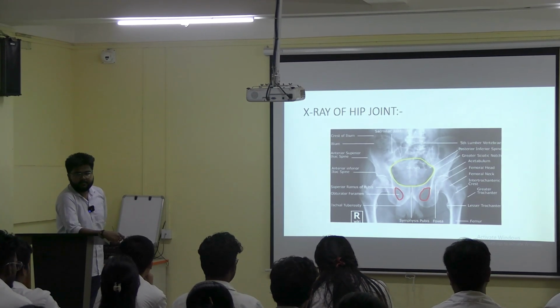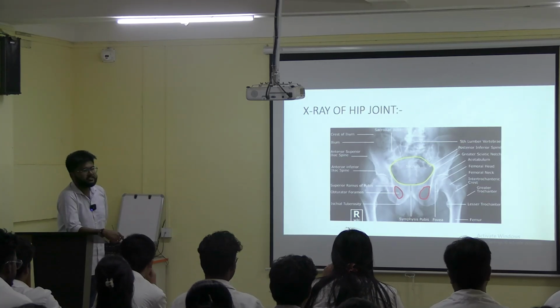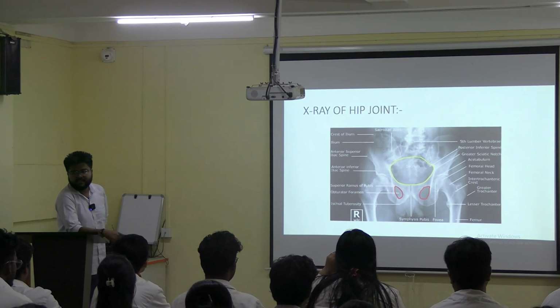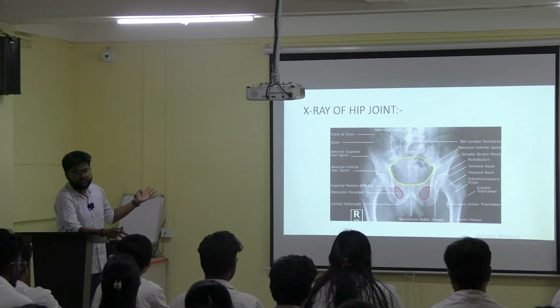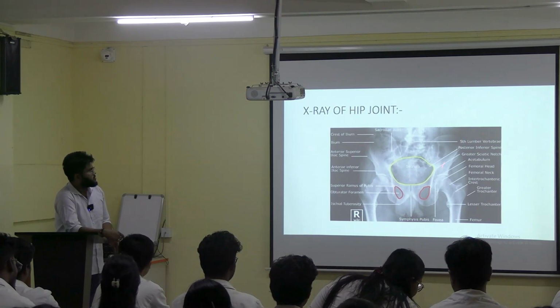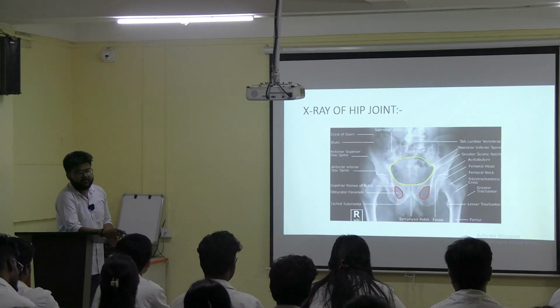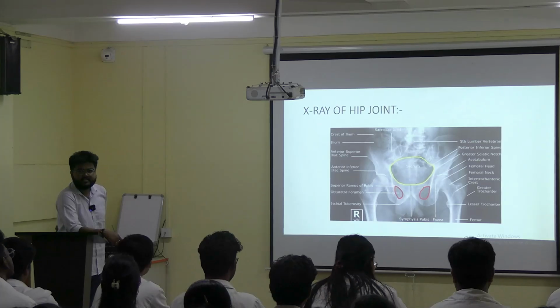The sacrum part and the ilium part of the hip bone together are called the sacroiliac joint. This is the plain variety of synovial joint. So there are 4 joints: the hip joint, which is the ball and socket type of synovial joint; the sacroiliac joint, the plain variety of synovial joint; and the pubic symphysis and intervertebral joint, which are secondary cartilaginous joints.